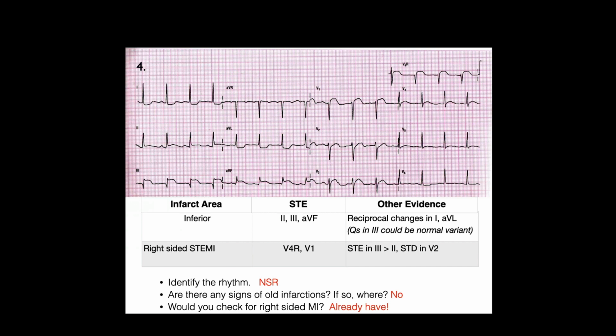Yeah. So, kind of going off that, I wrote anterior, because V3 raised ST. I'll go along with that. So where did you put ST elevation for the anterior? On V3. Okay, so if you have ST elevation in V3 it'd have to be in V4 as well, or V2; you have to have contiguous leads. So is that elevation in V4?